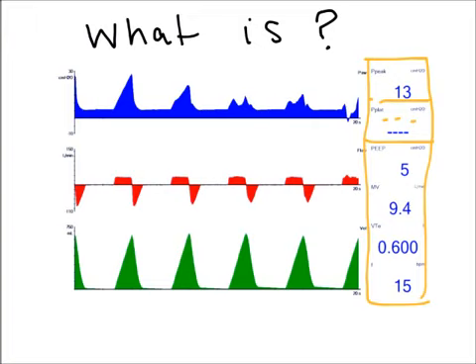during the inspiratory phase. And if we look at the waveform, here's a standard pressure waveform in volume control ventilation, where it rises and I do not have a pause at all. So I do not have a no flow state during this inspiratory period.